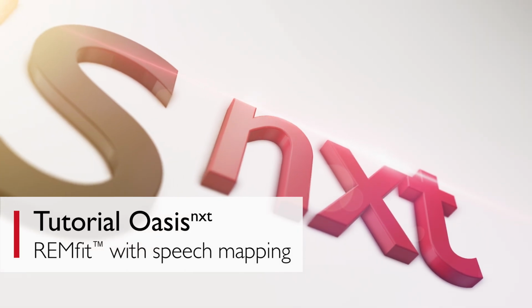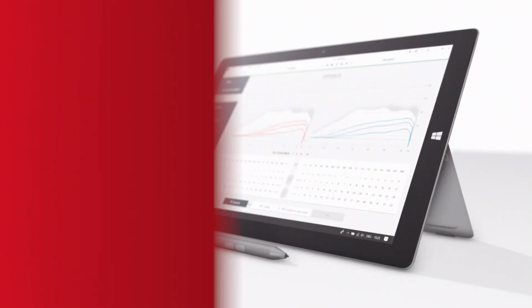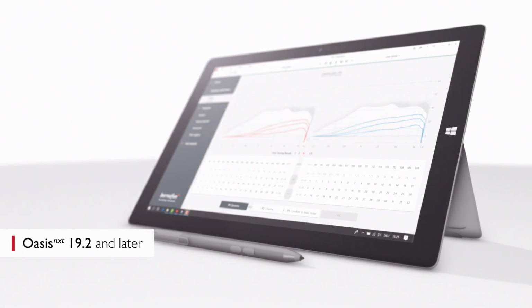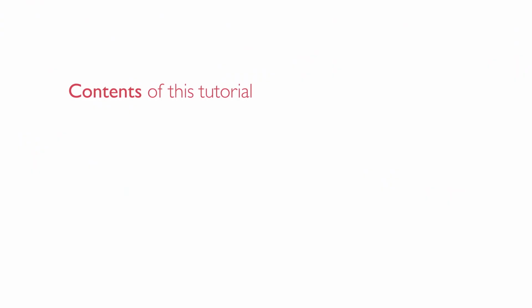Welcome to this webinar on Bernafon's OasisNXT fitting software. Today we will introduce a new feature which is available in OasisNXT 2019.2 and later versions. We would like to show you how you can automatically and manually fit your client's hearing instruments to the prescribed target by performing a REMfit in OasisNXT with speech mapping.